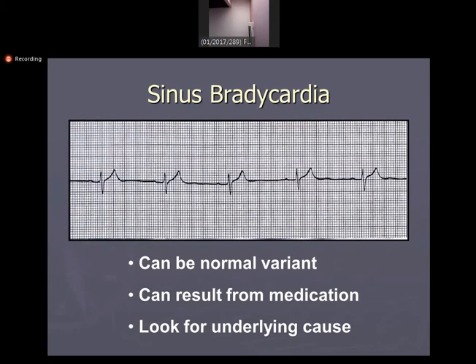So if we sum up, an ECG is a graphical representation of the electrical activity of the heart. On the large boxes, horizontally is the time and vertically is the voltage. Time: 5 large squares equal 1 second, and 10 millimeters vertically equal 1 millivolt.